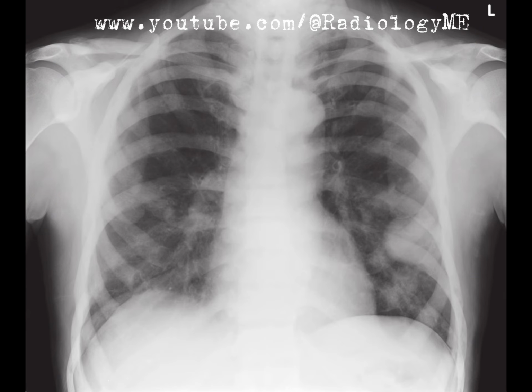Now, anticipated questions from the examiner might be something like, what are your differentials for diffuse bony sclerosis? In this case, I'd emphasize that while metastatic prostate cancer is the most common cause in men, other differentials include metastatic breast cancer, renal osteodystrophy, and esoteric causes like osteopetrosis or Paget's disease.